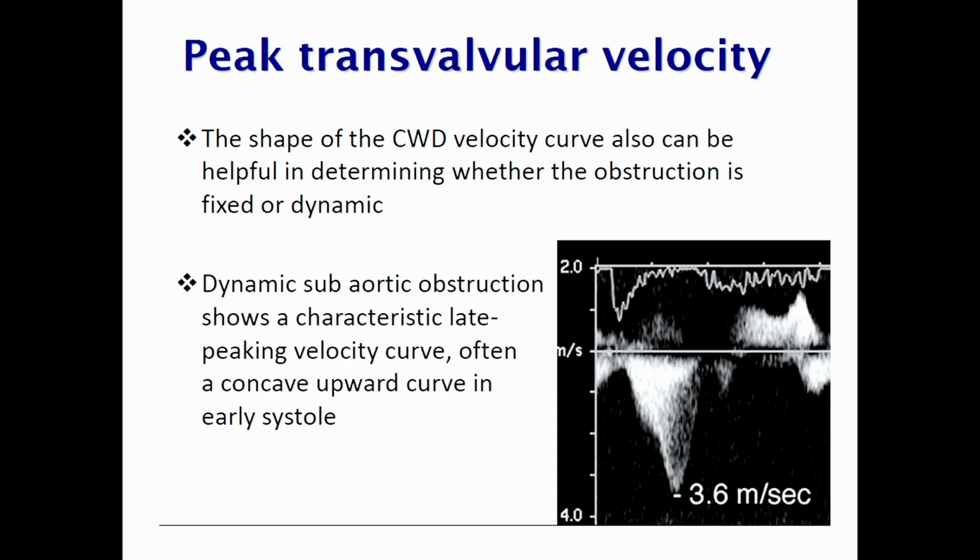Another classic example of that is SAM, which we were always discussing. The mitral leaflet comes in between and causes the problem. This is a classic dagger-shaped curve, which is the reason you will get a similar curve. But then you obviously have to time it with the ECG to see at what stage it is exactly happening.